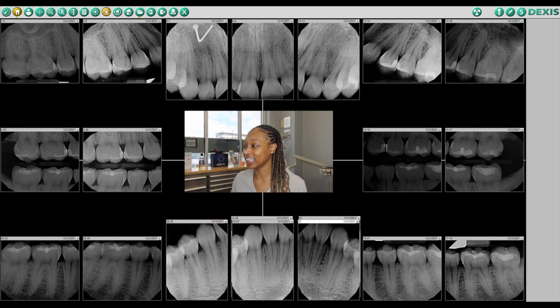So as I'm looking at these x-rays, I probably didn't choose a very great patient to do this on because there aren't a whole lot of dental materials, but at least we'll kind of cover surfaces and what a composite looks like, because she has a couple of those. So yeah, let's just get started.